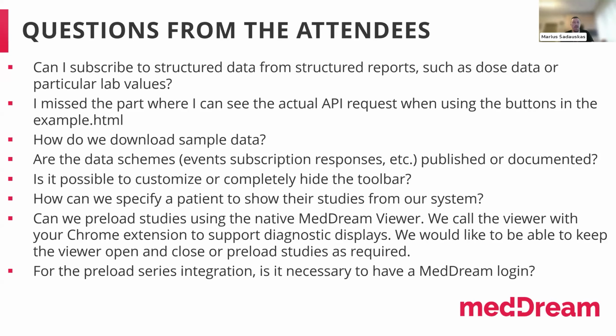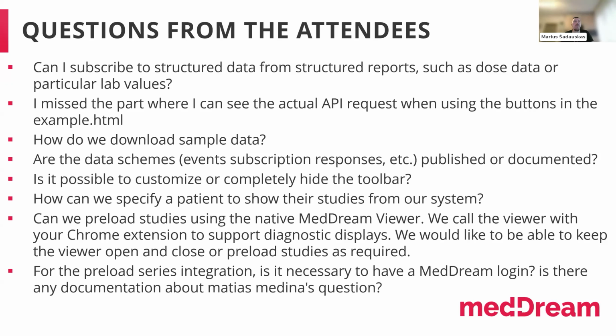It will start with viewport communication dot open instance in MedDream or something like that. So you will find this if you inspect this example.html file in some editor. And of course, all the API requests are available in our documentation. So you can open this documentation link and you will find it.